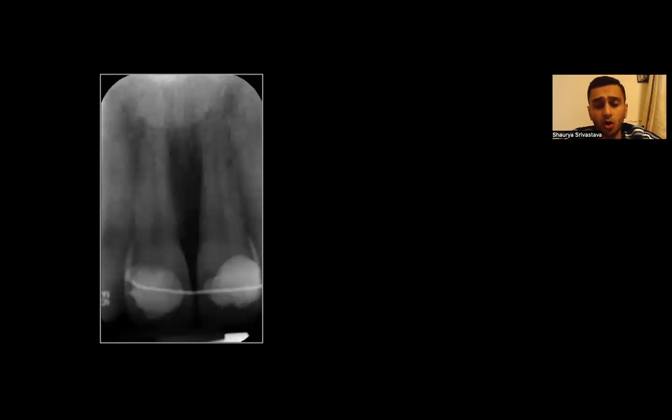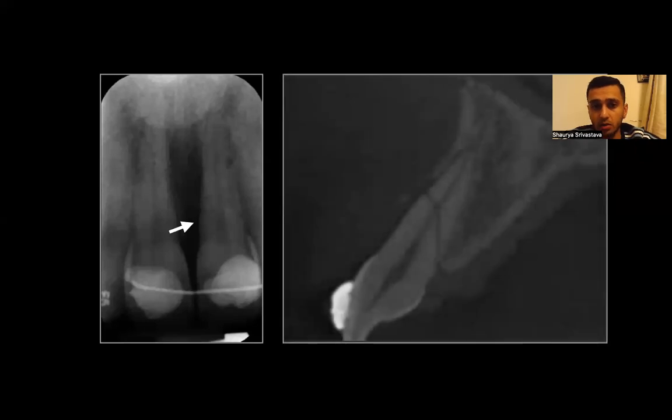This is a bit of dental trauma. Patient came over, referred by their specialist, feeling some pain, and the trauma was about 3-4 months ago. Tooth was splinted. Now I looked at that over there. There's some lateral widening. Wonder why. There's no apical lesion that I can see as well. What's going on? So we take a scan, and here it is.